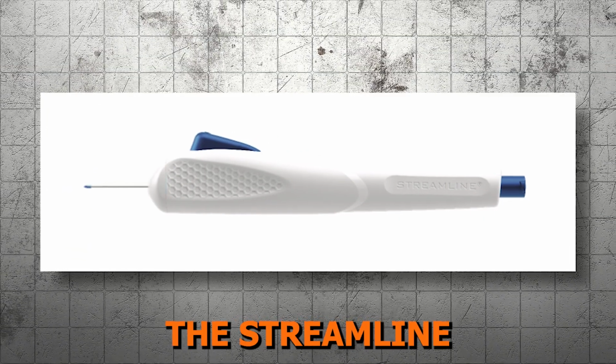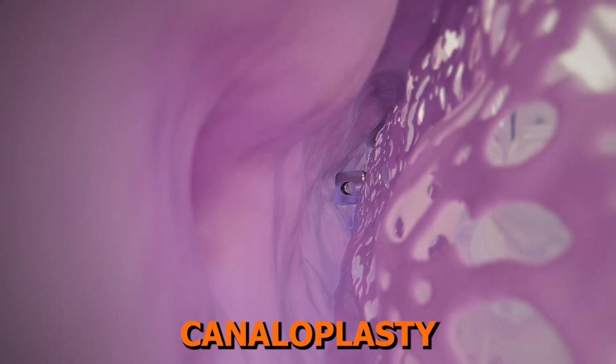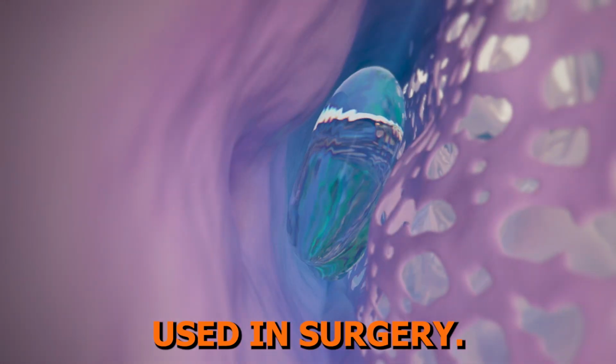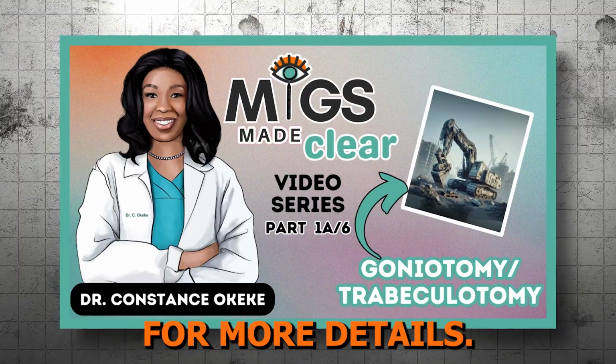Next up, we have the Streamline surgical system. This versatile device can be used for both canaloplasty and goniotomy procedures, depending on the technique used in surgery. We discussed the goniotomy feature in the Part 1A video. Refer to that for more details.